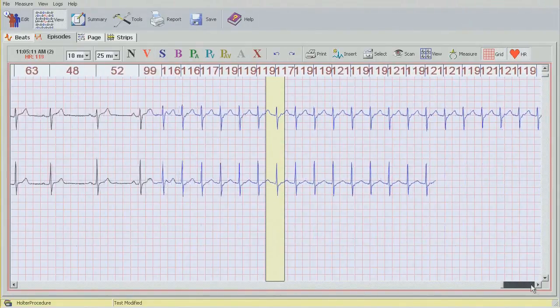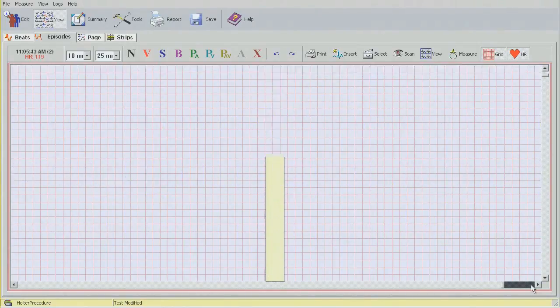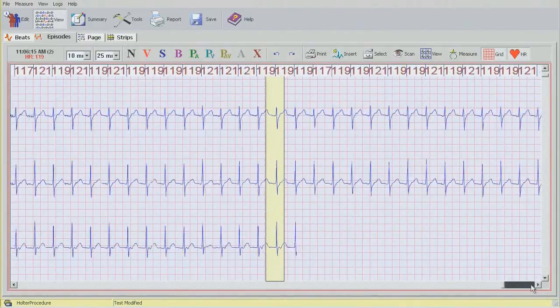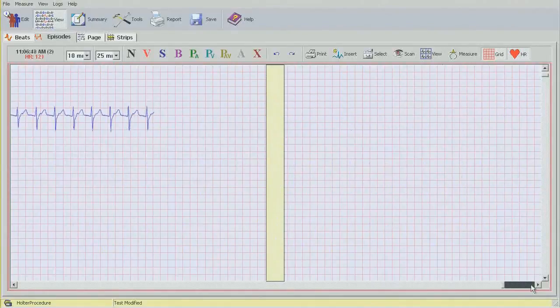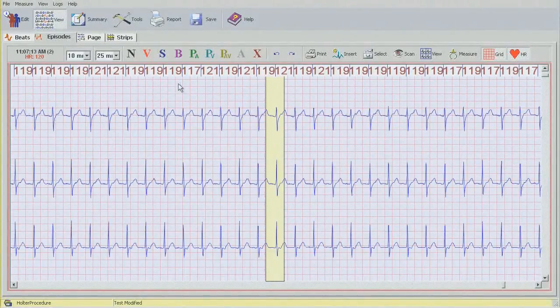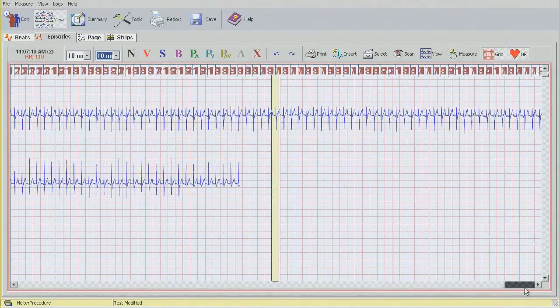Run. I'm just going to go back all the way. It's actually quite a long one. Just want to make sure I see the end of it and the whole run is labeled. Sometimes it's easier to change the speed again to 10, so this will speed up the process a little bit.